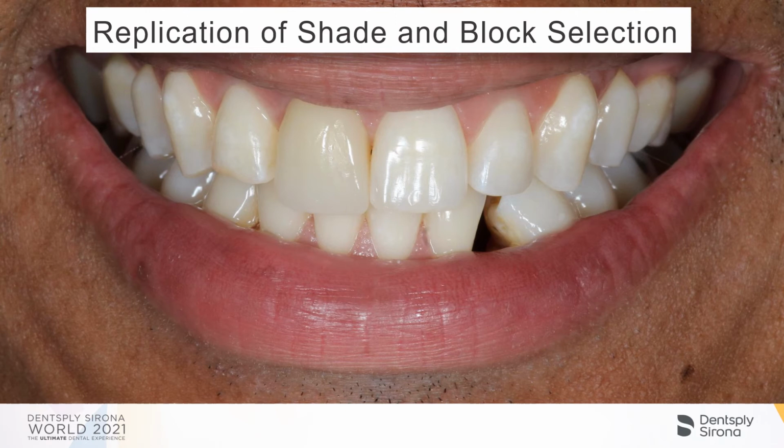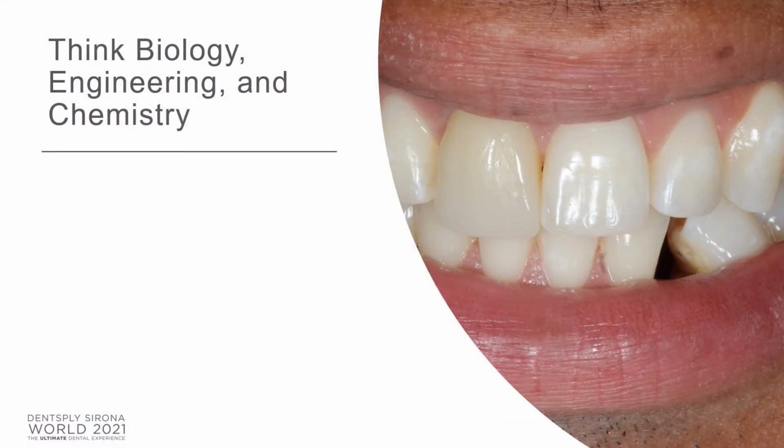So now we've talked about replicating our biological contour. We've talked about replicating our microanatomy or our consistency of the tooth. Now we have to replicate the color, our final C, by replicating the shade and selecting the proper block. So again, we have to go back to some of the principles that we talked about earlier on in this presentation. We have to think biology, we have to think engineering, and we have to think chemistry. If we want our restorations to be successful, we have to tick all three of those boxes.